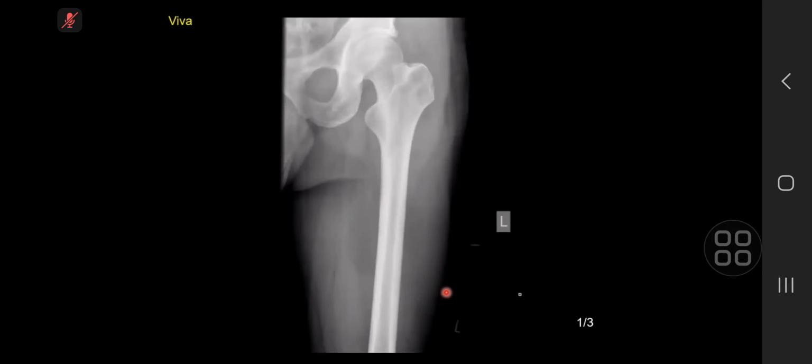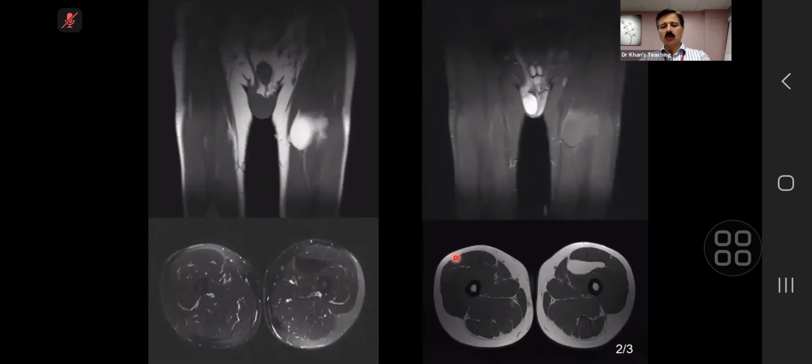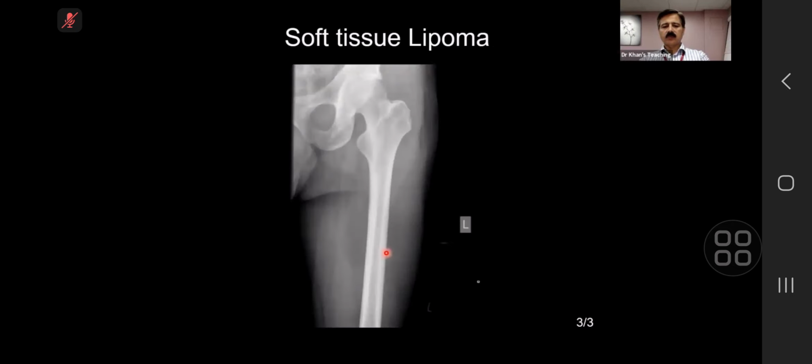Because it seems to be increasing the transmission of the X-rays, it must be less dense than normal soft tissue, so potentially either a large cyst or a lipoma. Oh no, sorry, just a lipoma. Lipoma, it's low density, means it has to be less than soft tissue. So on an MR, this was confirmed. If you see here, and it saturates here.